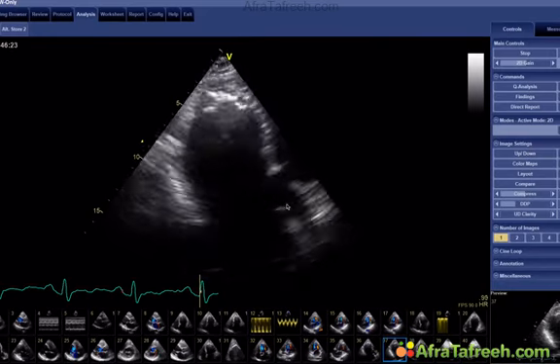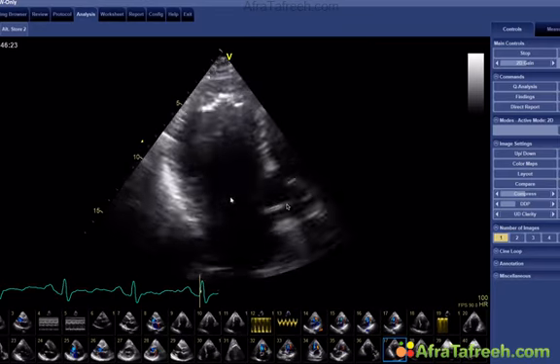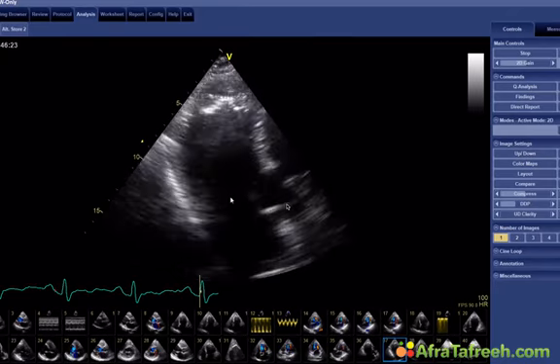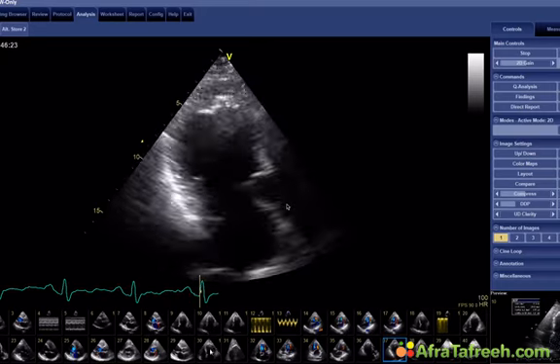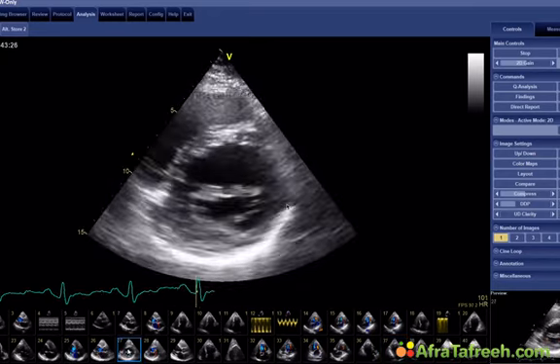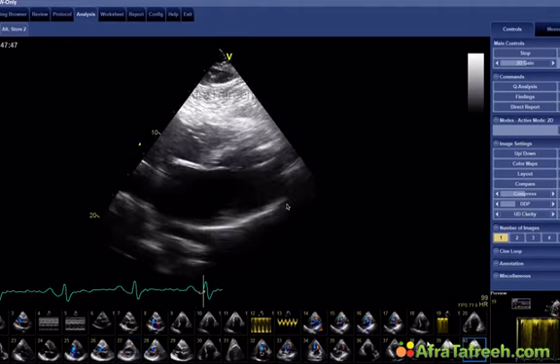Certainly this is something you have to consider. Now, obviously it's possible because the patient has fibrosis of the mitral valve, and it could very easily be that they're susceptible to chordal rupture. Now, we've never seen a case of restrictive cardiomyopathy with chordal rupture before, but it is certainly something which is possible. And we were considering this.